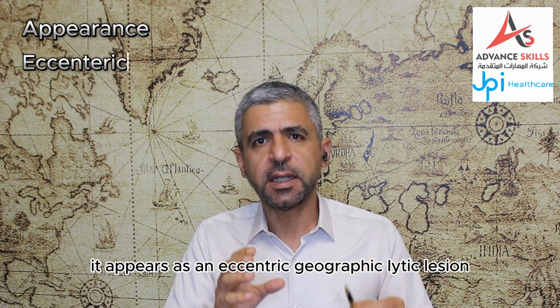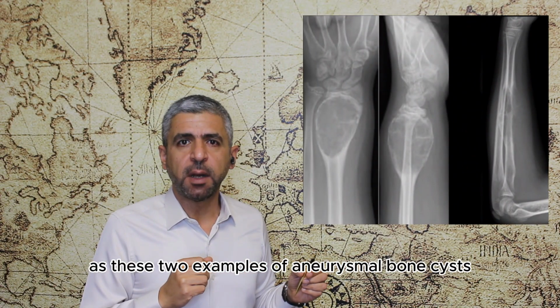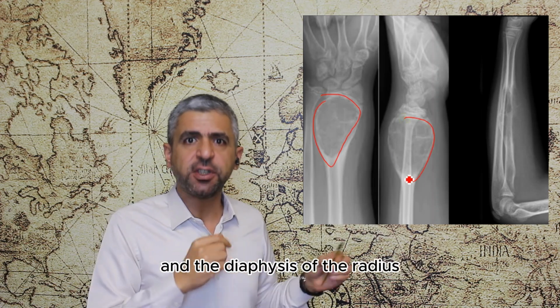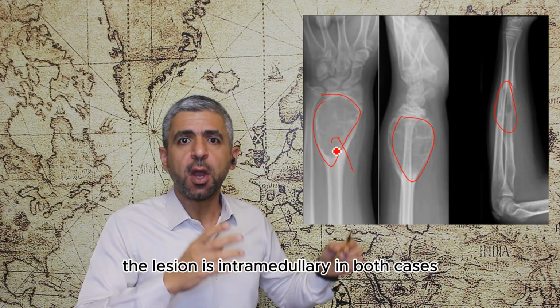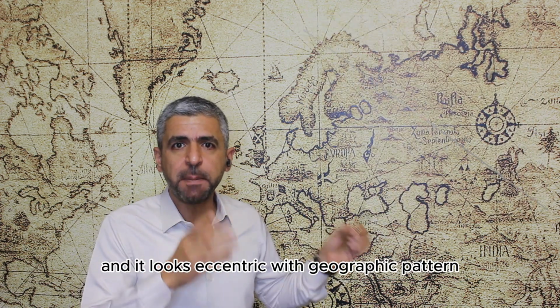It appears as an eccentric geographic lytic lesion, as in these two examples of aneurysmal bone cysts, involving the metaphysis of the radius and the diaphysis of the radius in two different patients. We can see the lesion is intramedullary in both cases with variable size, and it looks eccentric with geographic pattern.